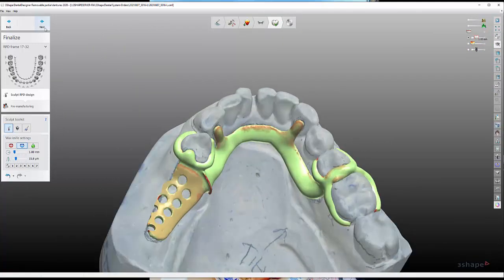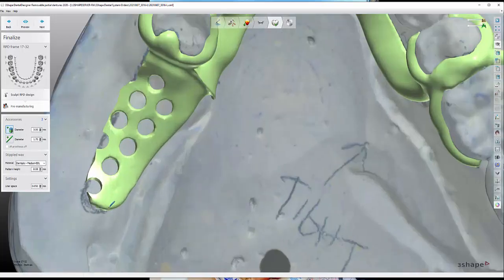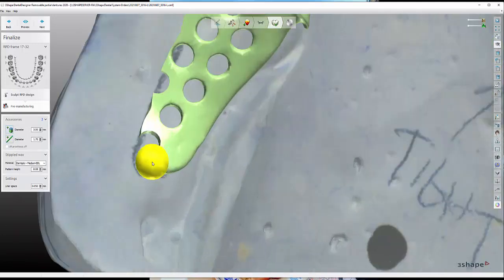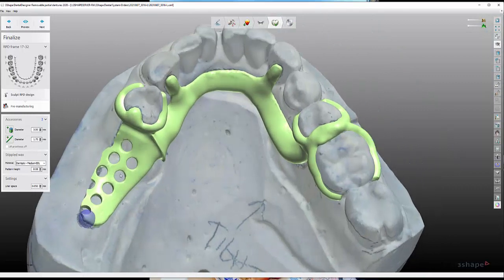All right. And the very last thing, our default here is 3 millimeters on the tissue stop. That's the one thing we never draw on our drawings, but on a free-end saddle like this, we always want a tissue stop right there. We're not going to need to do any crossbars or any sprue connectors.